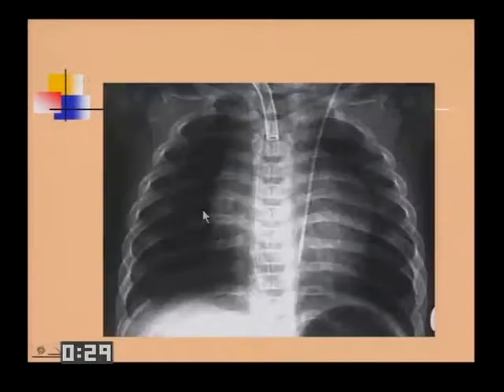Okay. An old pixely kind of slide, an unusual kind of endotracheal tube because the child had tracheal abnormalities. The abnormally positioned vascular catheter should make you at least suspicious that something is going on unusually in the mediastinum. This is an example of what a tube in a left-sided superior vena cava looks like. A left-sided superior vena cava can be a normal variant, but it's an uncommon normal variant.